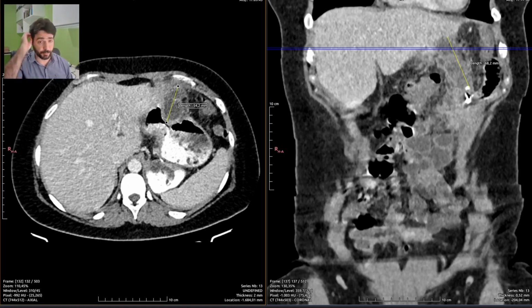Let's report it now. So the gallbladder is gone. I can say there are post-op signs on the stomach and the bowel. There is oral contrast, ingested contrast. I have to say it on the report.